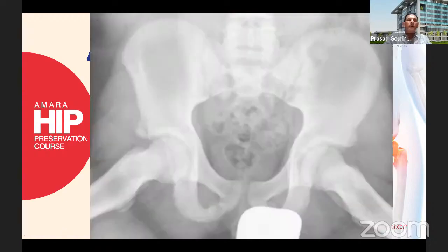Now, a few little variations to look at. A younger person with a very prominent AIIS may even have had an avulsion fracture because it's more prominent than the opposite side. This is called AIIS prominence or a type 2 AIIS that can cause impingement, subspine impingement. The impingement happens between the spine and the neck of the femur, squeezing the rectus femoris and capsule. So looking at the AIIS is important when somebody has flexion pain, straight flexion pain.